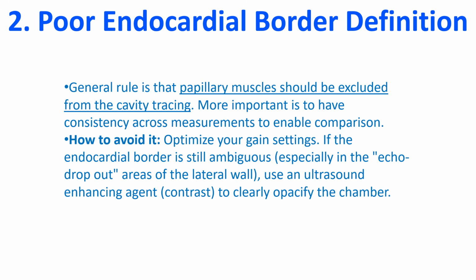How to avoid it? Optimize your gain settings. If the endocardial border is still ambiguous, especially in the echo dropout areas of the lateral wall, use an ultrasound enhancing agent, that is contrast, to clearly opacify the chamber.